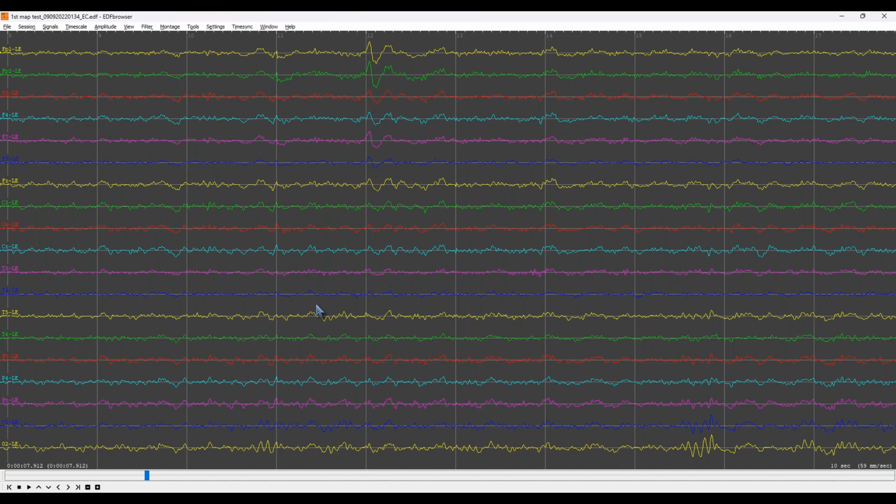based off the type of artifact we're seeing, whether it's, like I said, that short burst, if it's showing up more like a delta signal, or if it's more of that contracted muscle tension where you get that high amplitude compressed signal. That kind of narrows it down. Or if we see a very repetitive pattern in a beta frequency, and that's generally coming from electrical sources, just the way our low and high pass filters kind of overlap. The signal that we would see is around a 15 hertz signal with electrical artifacts.